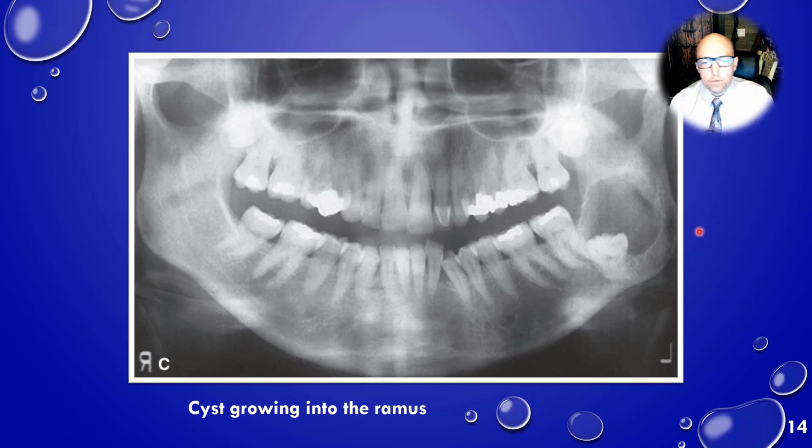All right. Hopefully you see this here. It stands out pretty readily. How would you describe the borders? Hopefully you recognize these well-defined corticated borders by now. The mesial surface, you don't really see it attached at the CEJ. Maybe there's a little follicular space here. But the distal definitely attaches just below the CEJ, and so this is most likely a dentigerous cyst.